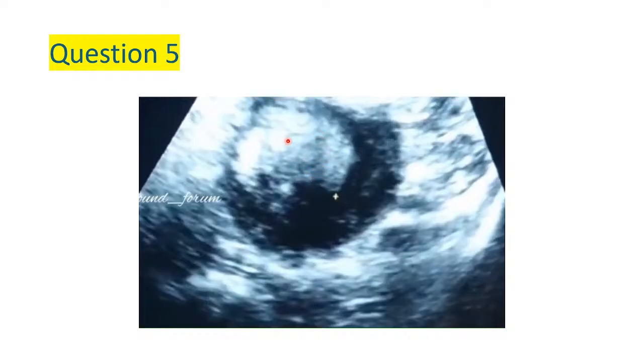So this echogenic mass, ladies and gentlemen, is in keeping with a lipoleiomyoma. So it's a fibroid that is deriving from fat. So it's called a lipoleiomyoma. It is the one that is echogenic, or that has got the configuration that looks like this. So this is a lipoleiomyoma.